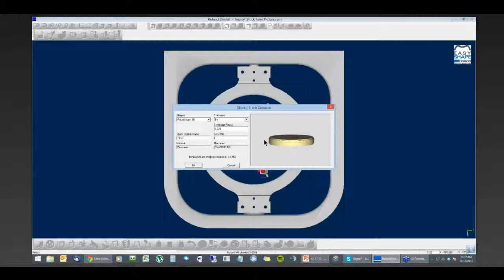So for some reason, if you got a call from your zirconia disk manufacturer saying, hey, this lot was bad, we need to recall those products, it's a good thing to have this lot code because you can print this out on your run reports, and you can use this for your traceability if you need to go back in the instance that there's something wrong with that material. We're going to leave that blank for this presentation though.